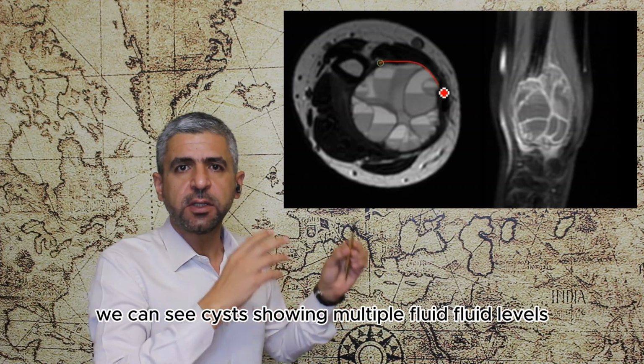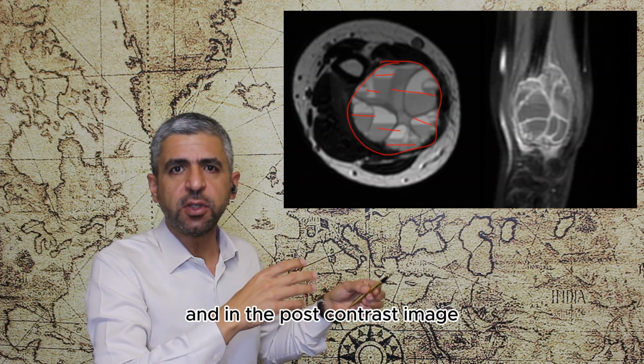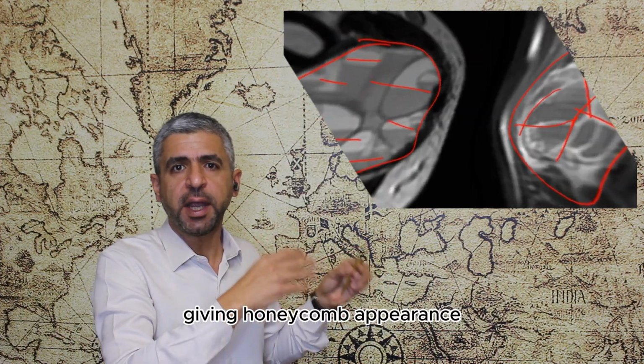Another example of T2 weighted image and post-contrast image. We can see cysts showing multiple fluid levels, and in the post-contrast image, we see no enhancement of the cystic component with enhancement of the septal component, giving honeycomb appearance.